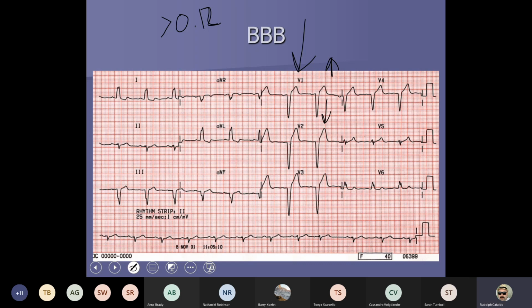And when I say majority, because I can't have complexes that's still a right bundle branch block, but it looks like this. Well, a majority of it is still up because I have 2 parts that are up and only 1 part down.